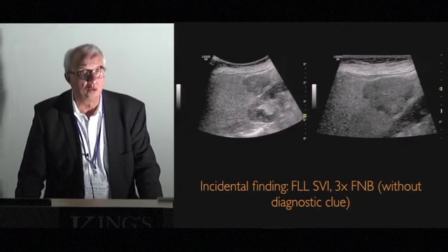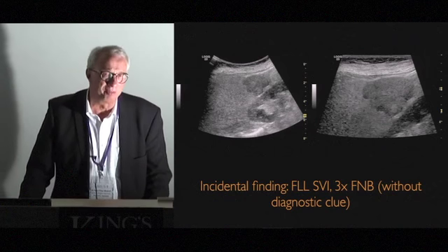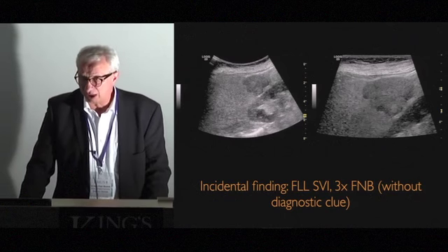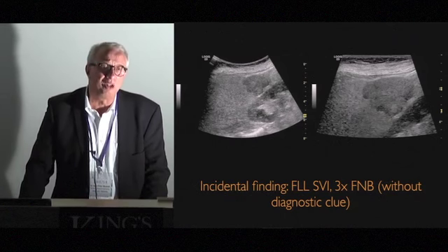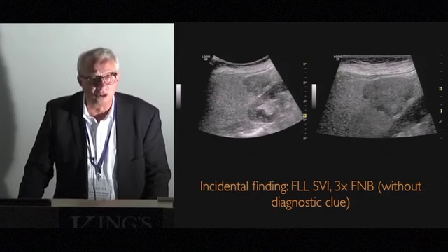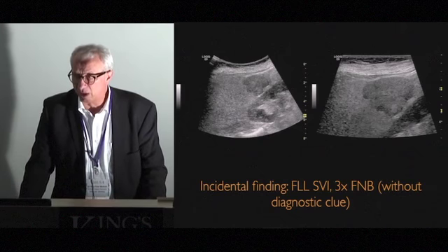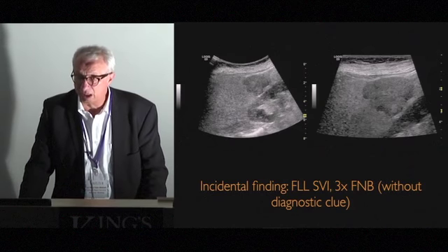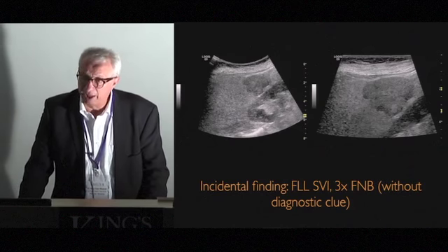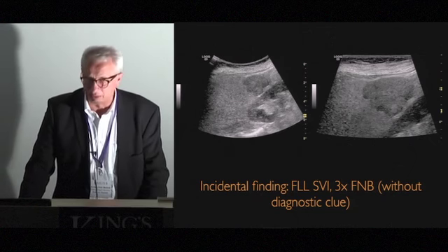Okay, so this is a patient who was in another hospital, and this lesion was suspicious. So they said we biopsied. They did 3 fine needle biopsies, and all the biopsies showed no pathology. So then the patient was really upset about that, and he left the hospital, came to our place, and we were looking at this lesion and found out it is really not typical.